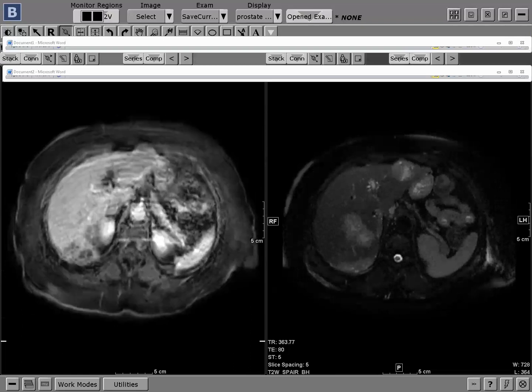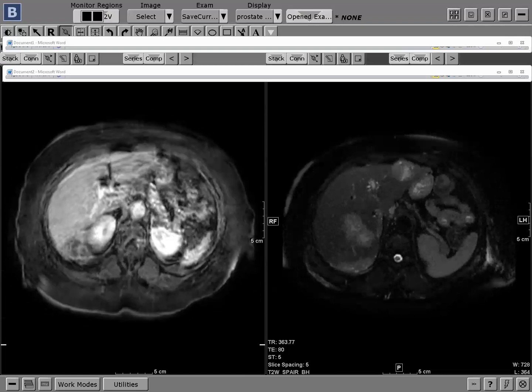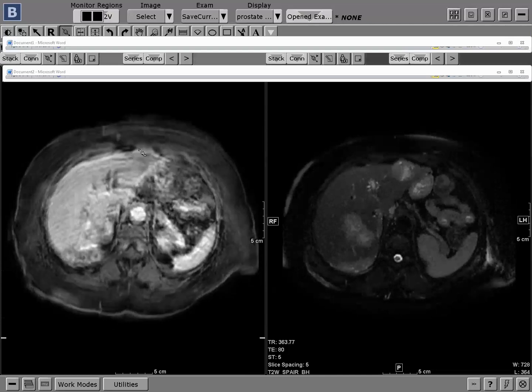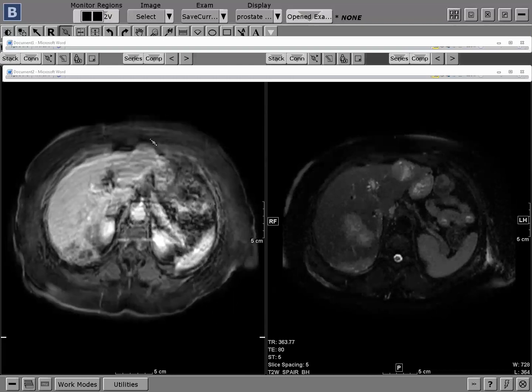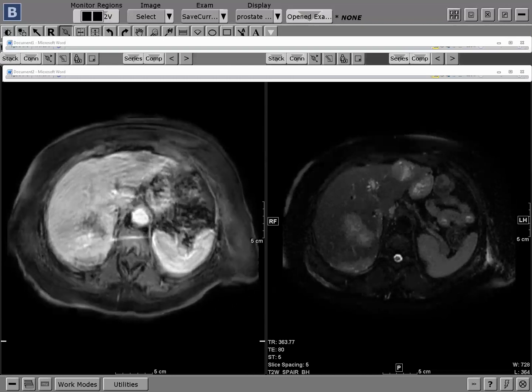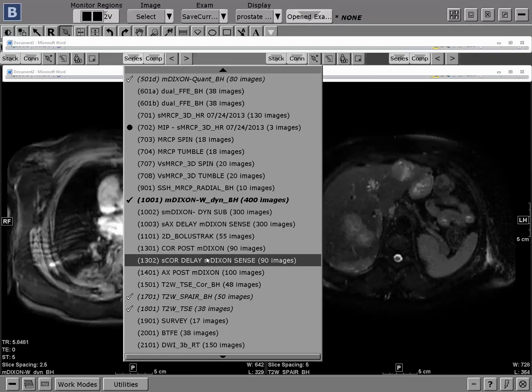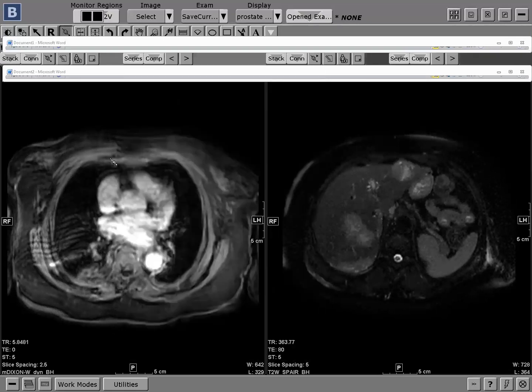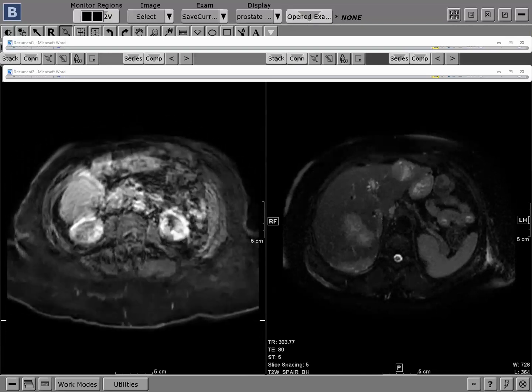So my colleagues brought this case to me and they said, well, how would you report it? Clearly these are masses, but how do you report it? Do you assign a category? What do you do? And do you just assign category non-categorizable, which is what happens when the images are so bad that you really can't make heads or tails of it?